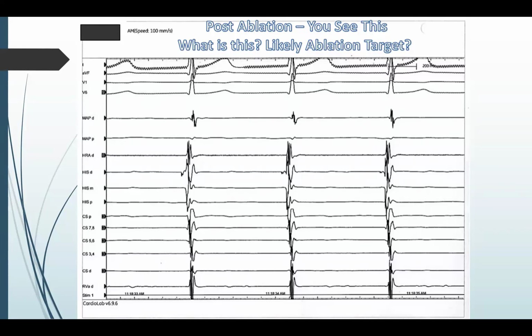Is there any intracardiac evidence to support that statement? To support me saying junctional? Yes, I agree. The ECG looks like it, and it is in fact junctional. But my question is, do we have any intracardiac evidence of that? When you're in junctional rhythm, what do we believe is firing faster than the sinus rate? Right at your junction. But what in the junction? Let's get electrophysiologic today.